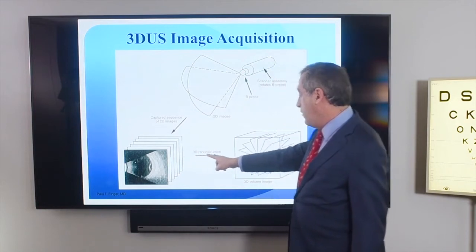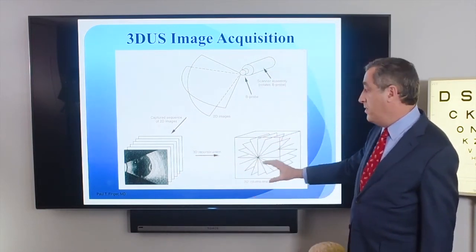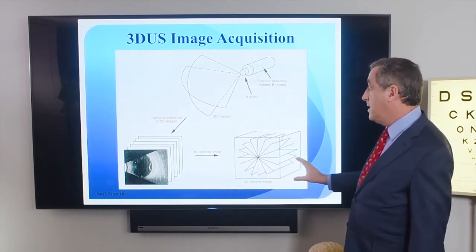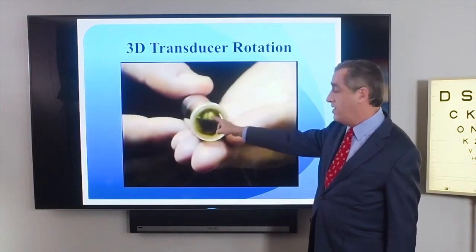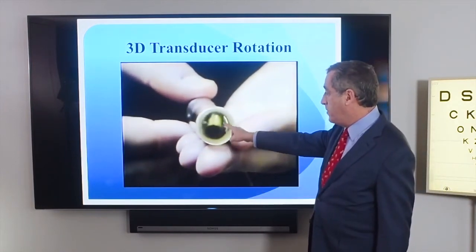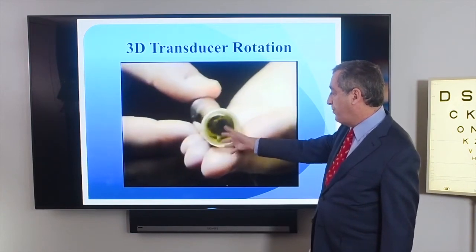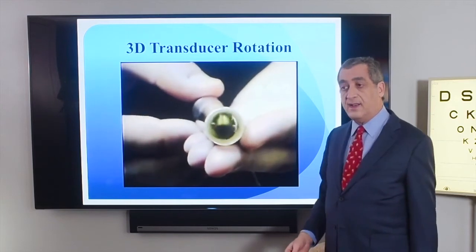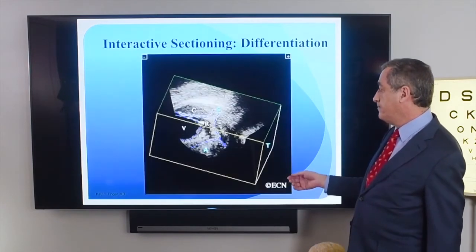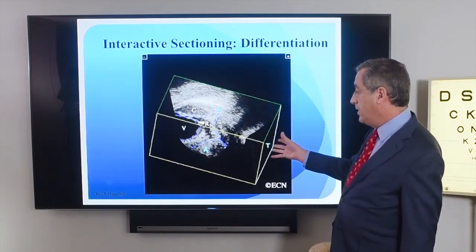by a computer and reconstructed into a three-dimensional volume. This was very valuable in ophthalmic oncology. This is the actual inside of a 3D ultrasound probe. You can see that the piezoelectric crystal is not only going up and down, but it's also rotating and collecting images for a 3D reconstruction. This was an example of a 3D image.